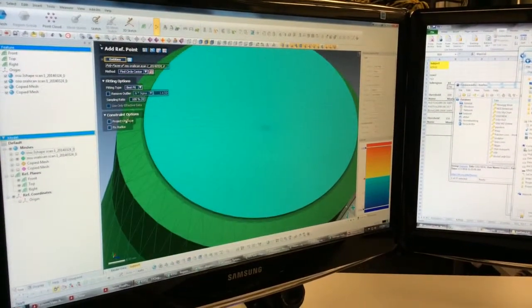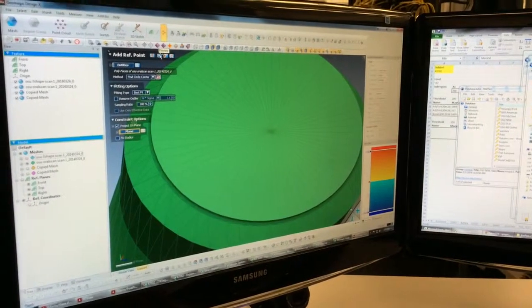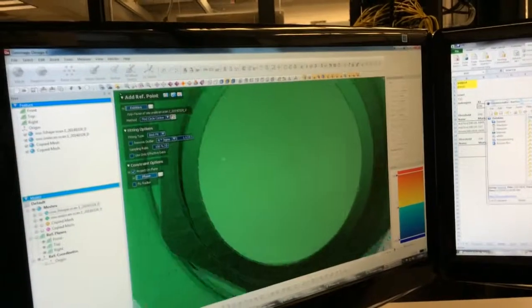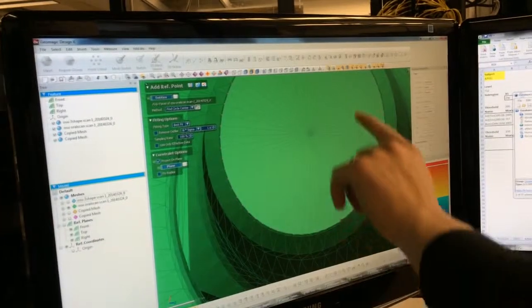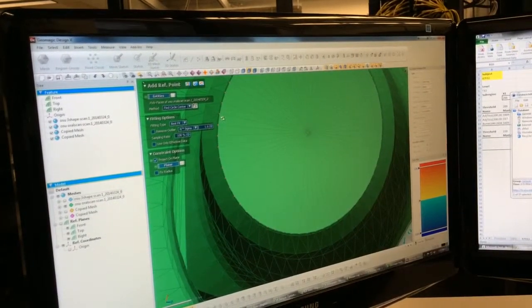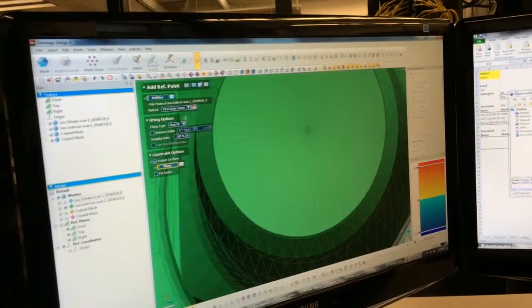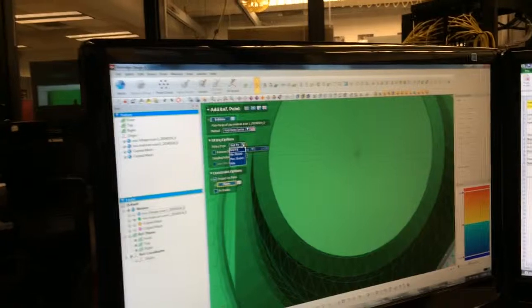Okay, so let's see. There are different constraint options here. What we can actually do is, this is a preview button, so we can see. We are getting two dots. Oh, sorry, the dots are showing vertices. So you have a whole bunch of triangles here, and those are vertices of the triangles. Okay, so why is it off? You have it on best fit.